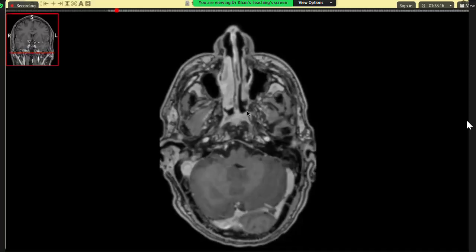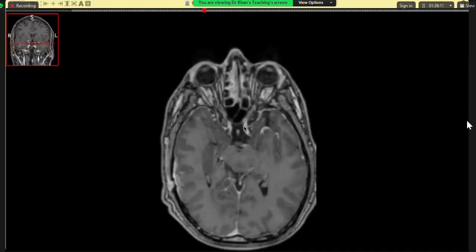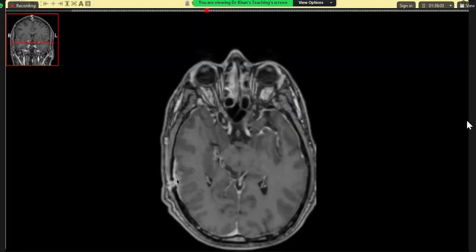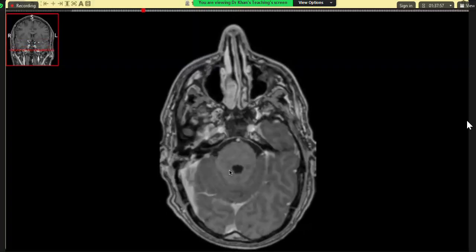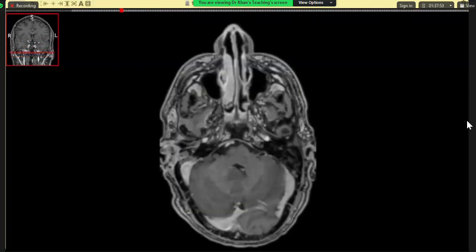Subsequently the abscess was drained and we have got a post contrast. So here it has been drained, and we can still see, but this is post drainage actually, just to make a point that there was a bit of enhancement here. But this is not for the exam. For the exam is that acute finding. Okay, good. So this was the teaching bit of today's session.